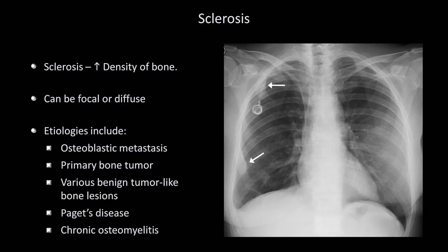Well, even if you are like me and find it impossible to differentiate these sclerotic lesions from one another, we can pick up clues from the other parts of the radiograph. First, what's this structure here? I'll talk more about these in Lesson 9, but it's an implanted intravenous port usually used for chemotherapy.